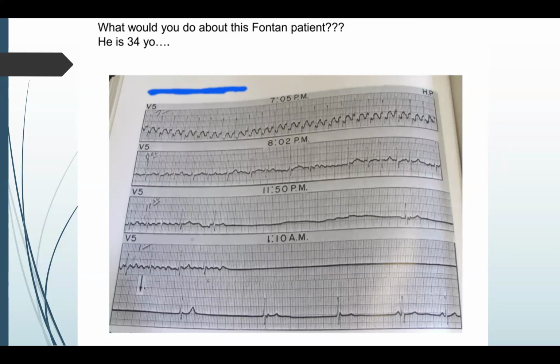Then on the next strip, you can't really see the QRSs too clearly, but from what I do see, it's not a regular rhythm. And the P waves, exactly where you're pointing, there could be multiple P waves. It almost looks like flutter, but it's not the clearest. Do you think the P to P looks regular or irregular? I'd say the overall rhythm looks irregularly irregular, like A fib, but the way the P waves look, maybe a little bit like flutter in that one section.